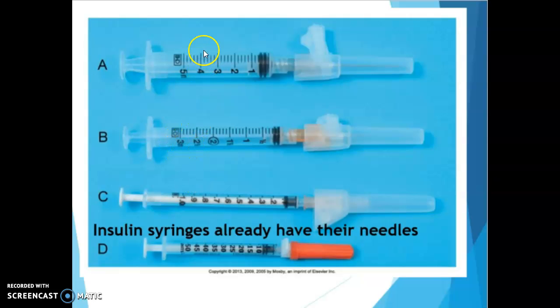This one's a 3 mil syringe, a 5 mil syringe. Okay, so lots of different sizes. You'll see that they do have a needle screwed into these Luer lock tips. Okay, now they've got different guards over them just to protect the sterility of the needle, but also to protect you. Okay, and we'll talk about some of these safety mechanisms a little bit later in the chapter.